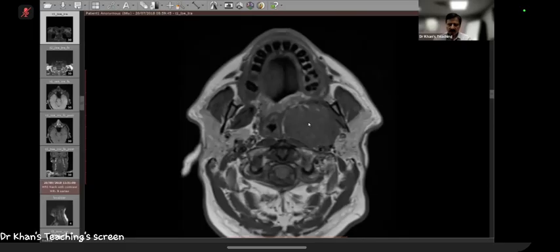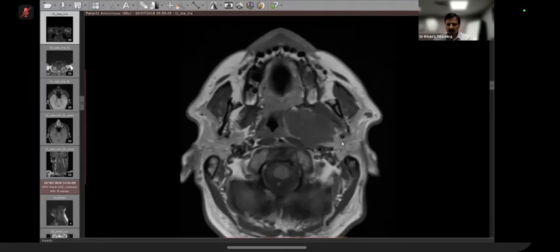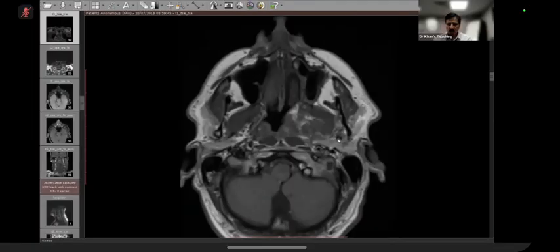So what it is doing is that, from the anterior side, it is completely compressing and displacing the fat posteriorly. I think what confused you is that part of the fat is here also. The portion of the fat which was here is displaced here. The mass is not classically anterior, it is anterolateral. So it is displacing everything posteriorly. This is displaced to the contralateral side. Initially, we were worried if it is from the deep lobe, then we go more distally, and we rule that out.